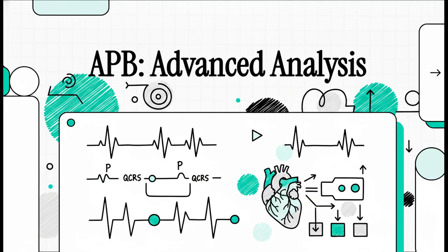Today, we're going to dissect a topic that seems foundational, but is actually one of the most diagnostically challenging entities in all of electrocardiography, the atrial premature beat, or APB. You'll also hear it called a PAC. Now, this is an incredibly common finding, but the way it manifests can be so profoundly deceptive, it can throw even seasoned clinicians for a loop. Let's really dig into the electrophysiology of why that is.